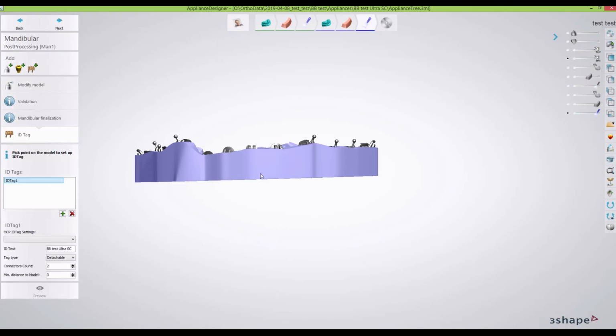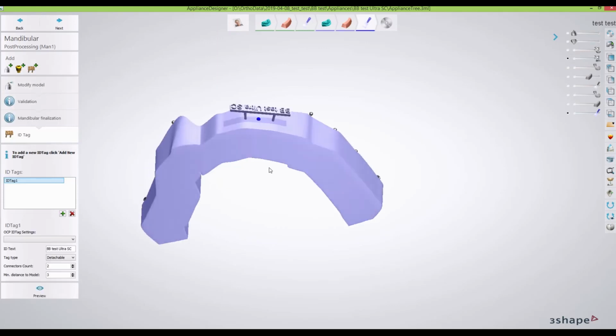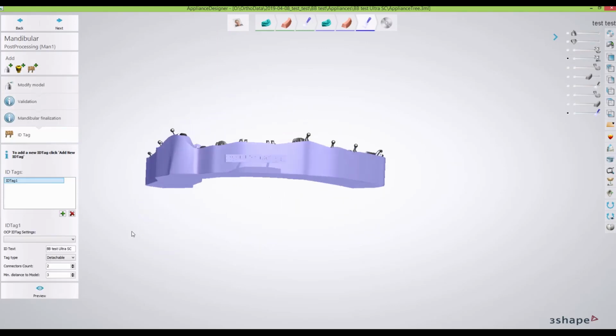If you forget and just do detachable, this is that thing. It's kind of weird. So let's go integrated. This is the bottom, so let's get rid of the ultra. Let's go ahead and put that in.